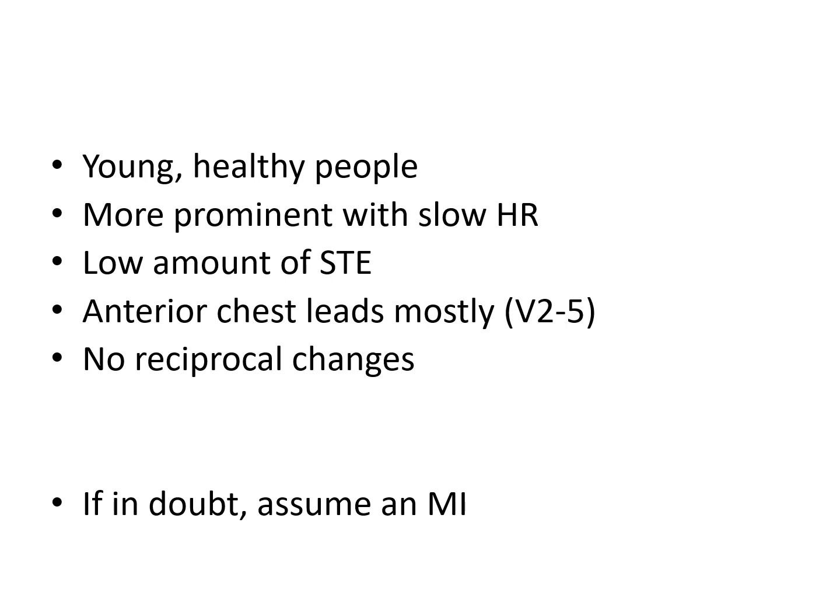It's mostly in the anterior chest leads, and there is no reciprocal changes. So if all of these things fit, then you can send these people home without any particular testing. It's a harmless condition. However, if you do have a doubt, either on account of the story or the risk factors or previous history, it's safer to assume an MI.